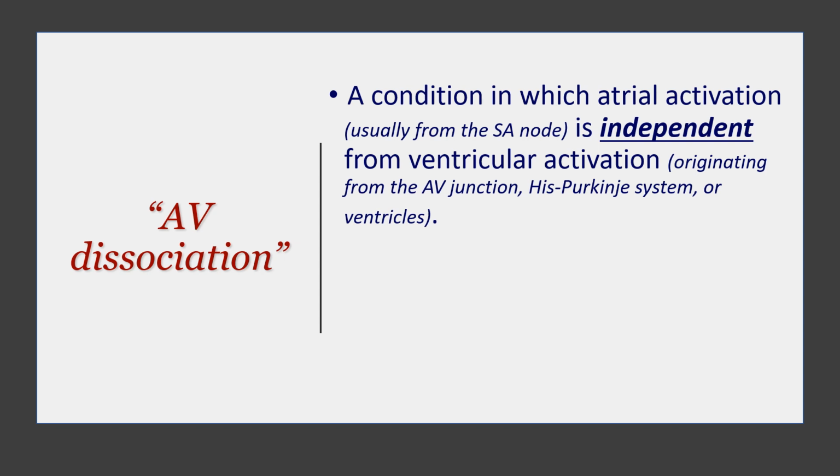independently. So if this is our heart, you will have the SA node firing from above, and then you will have another firing focus somewhere either next to the AV node or below it, somewhere in the ventricle, firing to stimulate the ventricle. And the atria will not be talking to the ventricle, hence the AV dissociation.